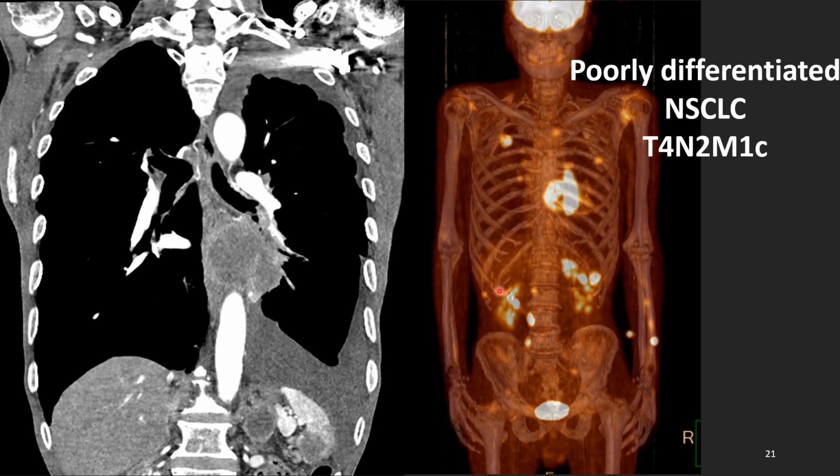Let's look at the coronal CT. Infrahilar mass with mediastinal invasion, large mass with pleural effusion, sure, malignant pleural effusion, and left adrenal mass, metastasis, and destroyed spine, and mass in the spleen, spleen metastasis. Left lower lobe mass with bone, adrenal, spleen metastasis with malignant pleural effusion at least. And let's look at the PET-CT. Left lower lobe mass with lymph node enlargement, right upper lobe metastasis, left upper lobe metastasis, multiple bone metastasis, spine, left adrenal, spleen metastasis.